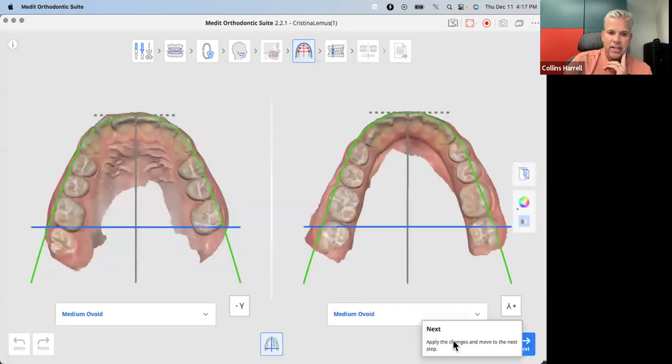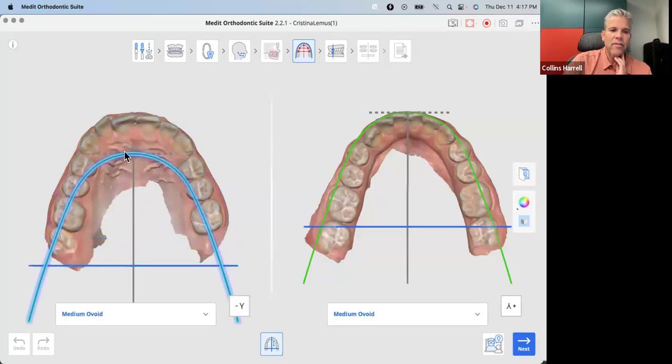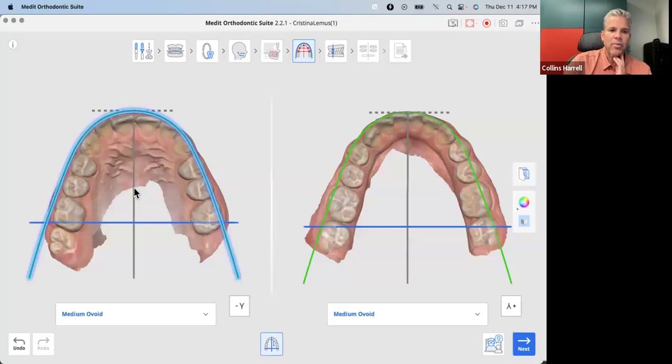So let's go ahead onto here, and I'm going to reposition this arch wire. This will be the one thing that will shift the midline a little bit. So we saw the midline shifting. Let's assume the patient does not need to have the midline shift. Then I'm kind of ignoring where this midline is here, and I'm more looking at the overall shape of the alveolar process.